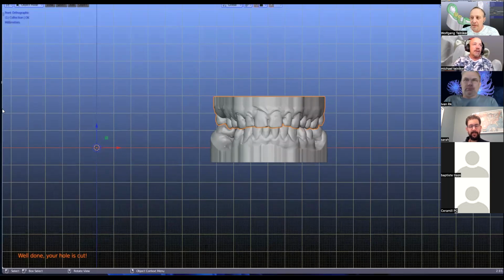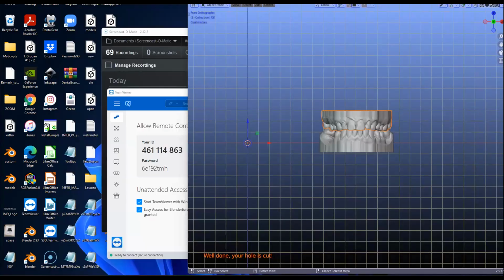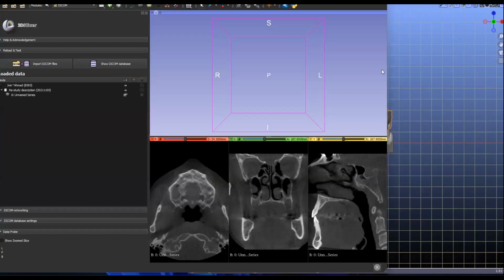So look, I'll be honest with you, it's quite good to have two screens because we're linking one software with another. If you've got two screens, you need a good graphic card. Most graphic cards have a few plugs in the back to have more screens. So I use two screens, but for tonight, we'll just cram them all onto one screen. So let's move that across like that.